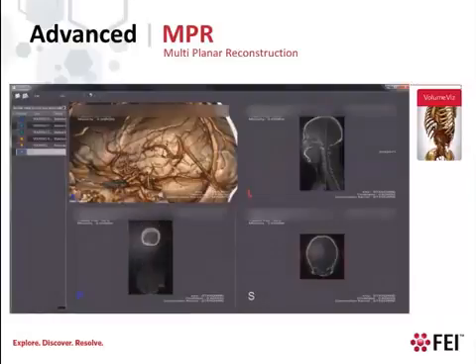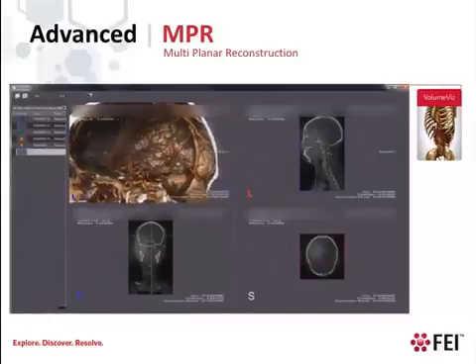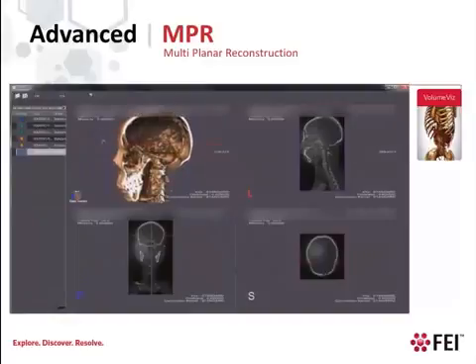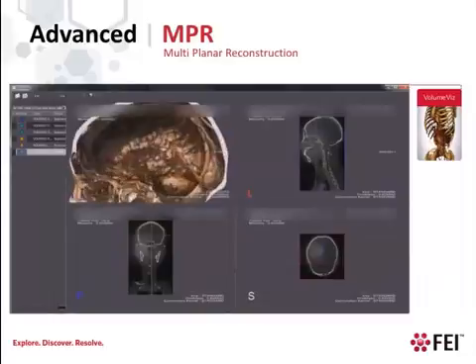In addition to lighting and material properties, Volume Viz also supports a variety of image enhancement techniques, including shadow rendering. Voxels that are at least partially opaque can cast shadows on other voxels and on geometry in the scene. Shadows can help the user perceive the shape and spatial relationships of structures inside the volume.